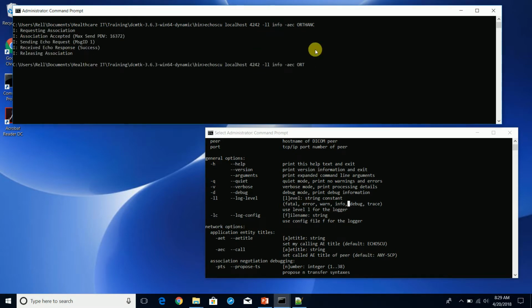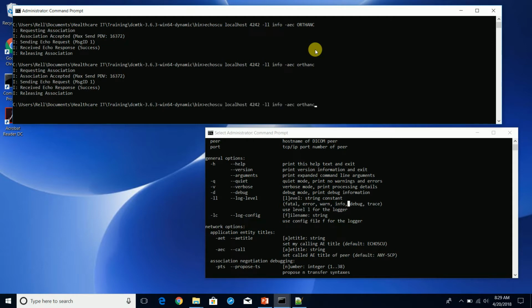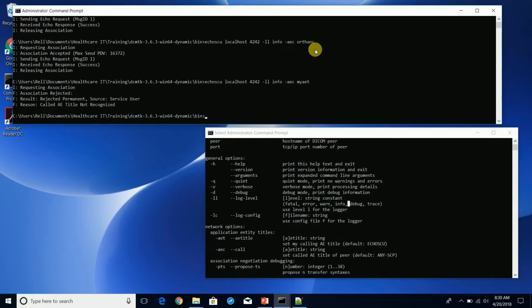Now if we do change the AE title, still success. There we go. Okay. Whew, it's trying to prove me wrong. So it looks like, okay, there we go.